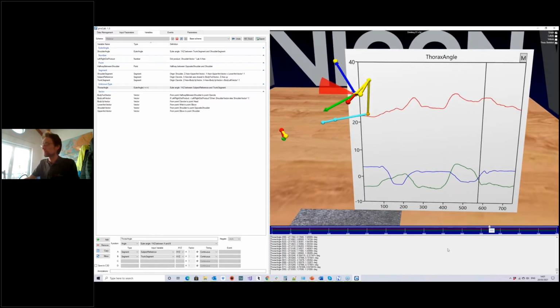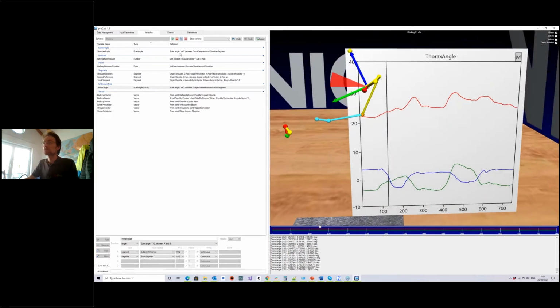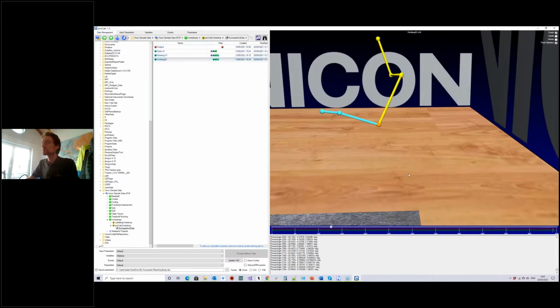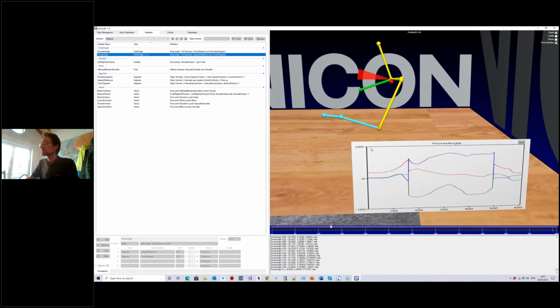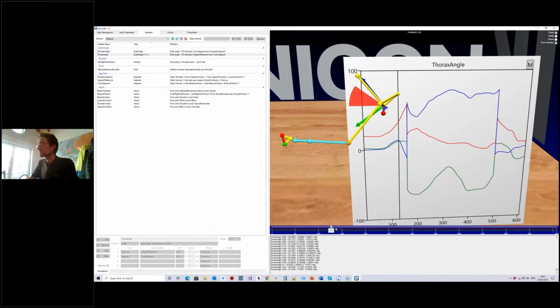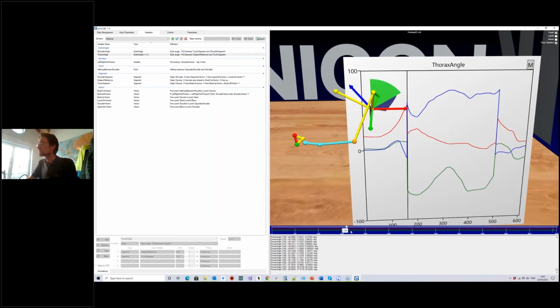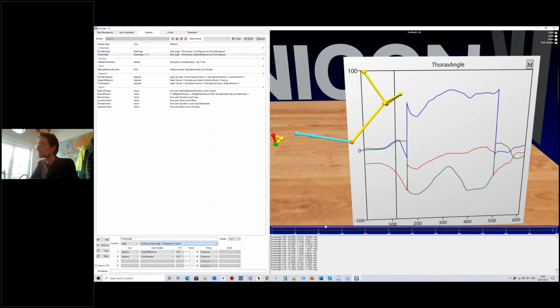Doesn't change very much, but on the other hand, we might see different results if we go and look at our second subject. Here we have the flip I was talking about, in which case we could potentially use the continuous Euler angle YXZ.